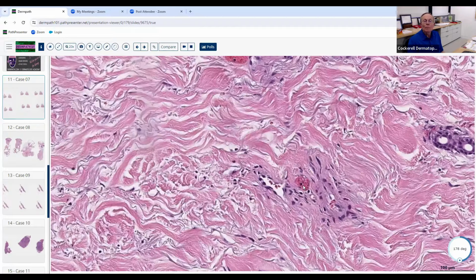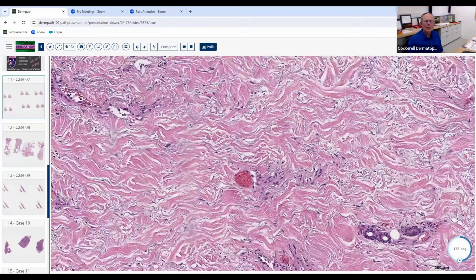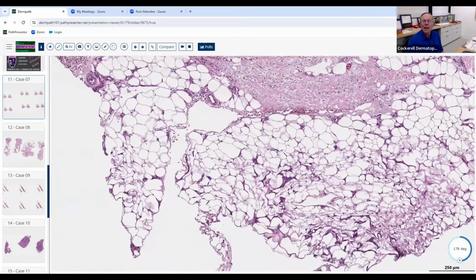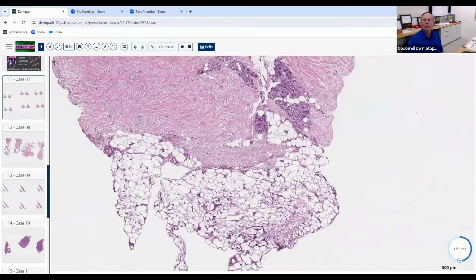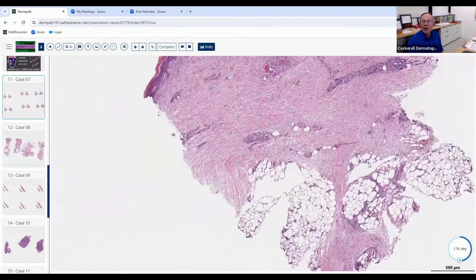And here we've got another blood vessel that's really sludged. We say, well, is this possibly something that's inside out? Is this possibly some sort of an infarct here that's happening because of some abnormality? And when we start looking for things like that, we start worrying about things like disseminated intravascular coagulation. I think you guys had a case that was presented last night at Grand Rounds.